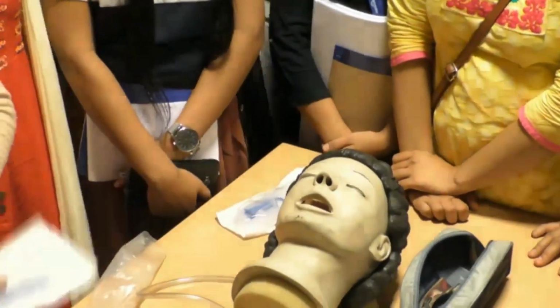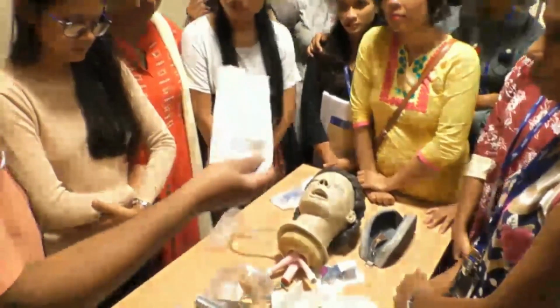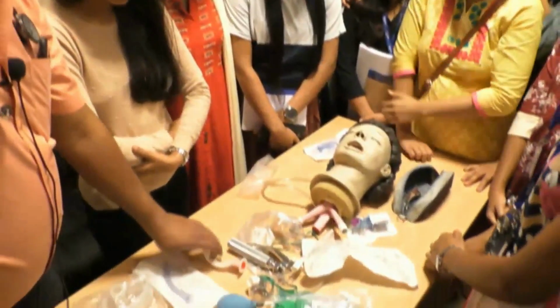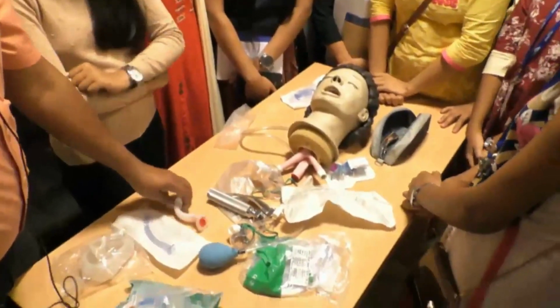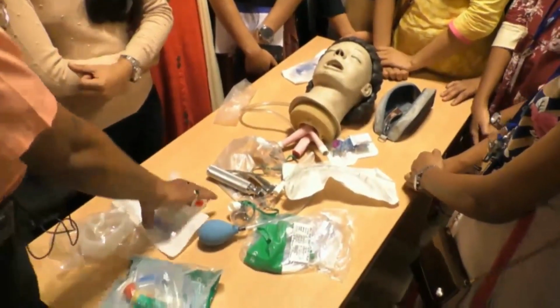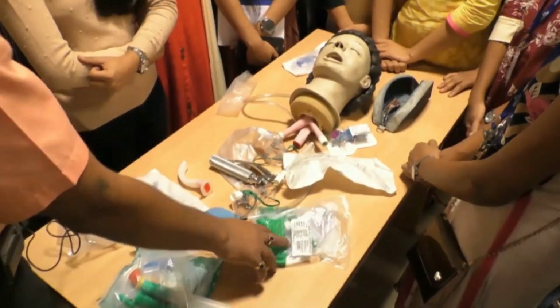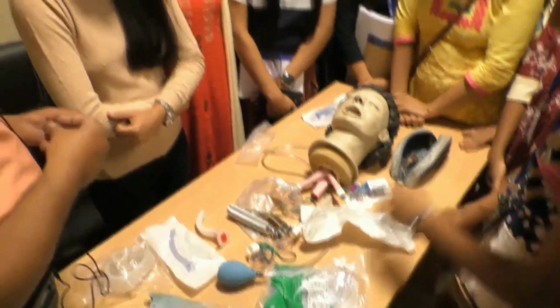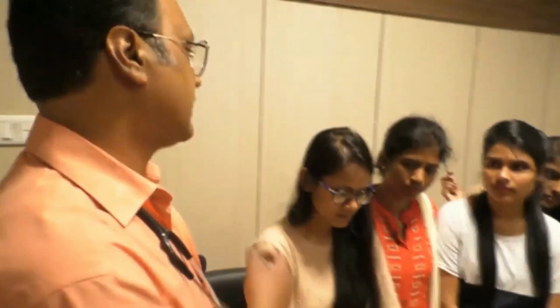समझ गया? ठीक है. We use it mainly for the tongue fall or upper airway obstruction basically. ब्रदर समझ रहे हो ना? हाँ? ठीक है. After this, we use nasal cannula. We don't have any nasal cannula here right now. What is the advantage of nasal cannula? And how much oxygen do we give through nasal cannula? 2 to 4 liters.